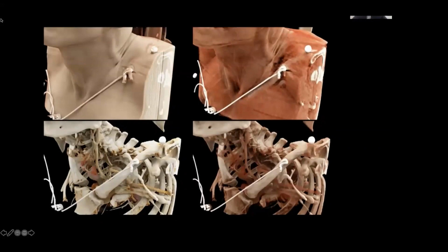So you can see you have your common carotid artery, your carotid bifurcation, your internal and external carotid and the various branches, and you can see the vertebral artery here. And again, there are different ways you could render this. So you could render this in a way that shows the bones a lot more clearly, that shows the granularity of the surface more clearly, that shows the vasculature more clearly, or not. So it's important to bear that in mind, but again, that's what it comes back to, your question.